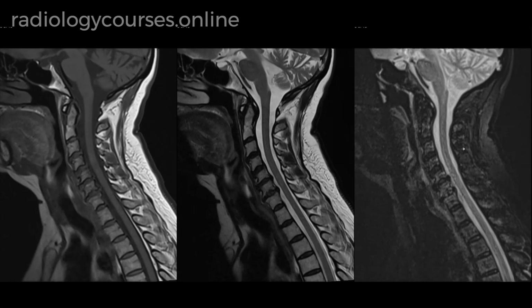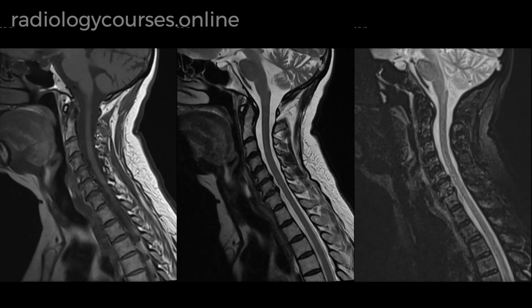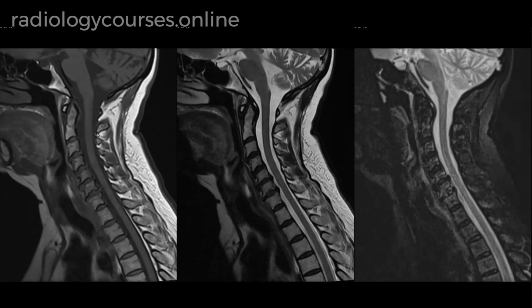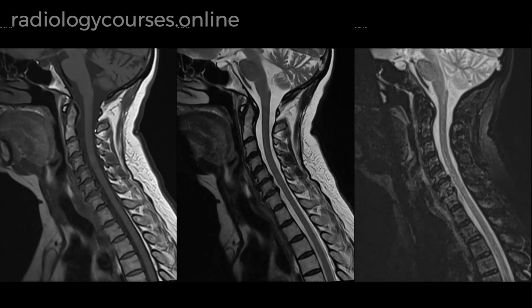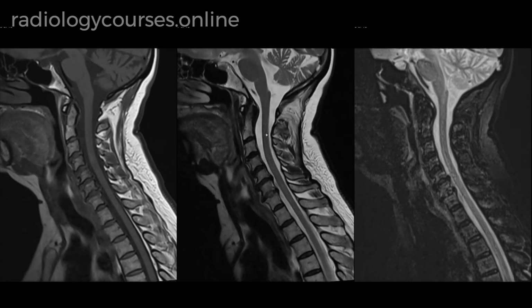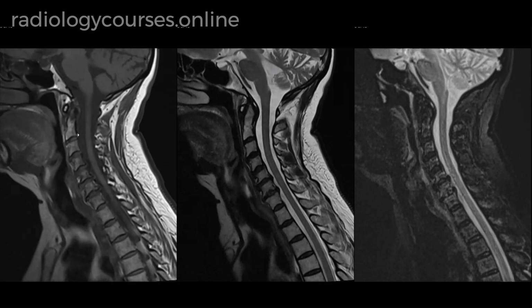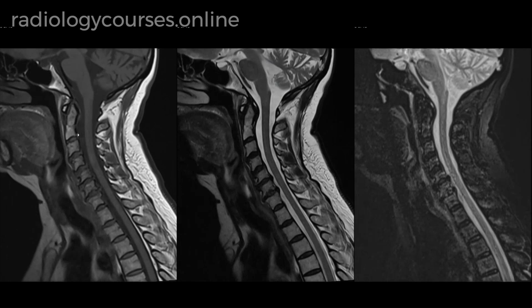This can be further confirmed with CT scan of the cervical spine and needs correlation with any past history of trauma. If there is no history of trauma, we need to look for any evidence of osteoporosis in this patient. This is unlikely to be of urgent surgical significance, but needs urgent clinical evaluation and proceed forward from there with CT of the cervical spine and, if needed, neurosurgical input.